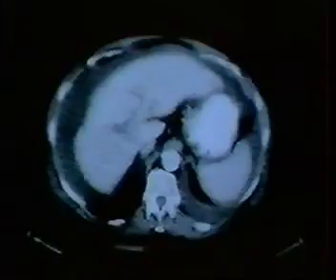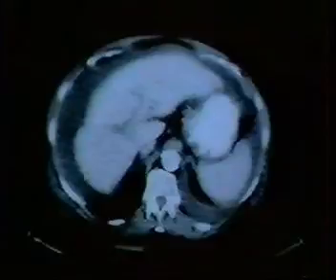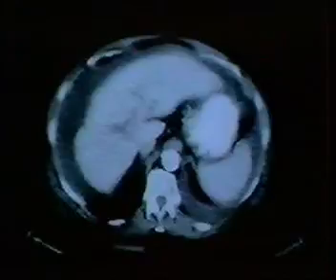A sign described by a group in Philadelphia at Hahnemann University is the fluid-liver interface, and I think you can extend that also to talk about the fluid-spleen interface. When you have fluid up against the liver or spleen and it's very sharply outlining the liver or spleen, that tends to be intra-abdominal fluid. You can have pleural fluid that comes close to the liver, but it will generally have a fuzzy interface with the liver, and the reason is that although you may have a hard time imaging it, you've got the hemidiaphragm curving through the plane of section, and so in fact the fluid is not really right up next to the liver. And so I think this liver fluid interface sign is a relatively useful sign.